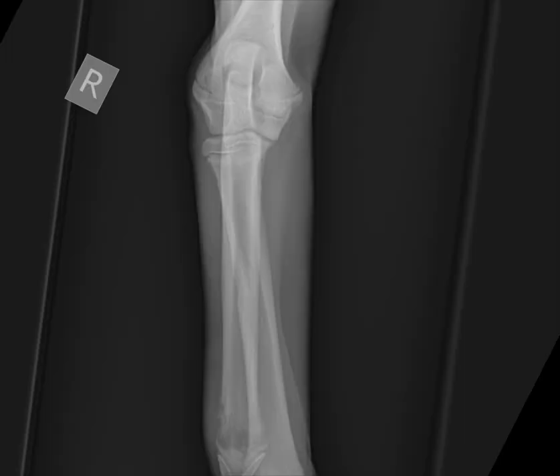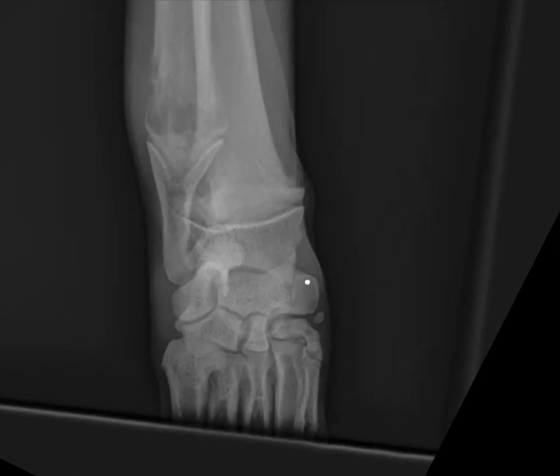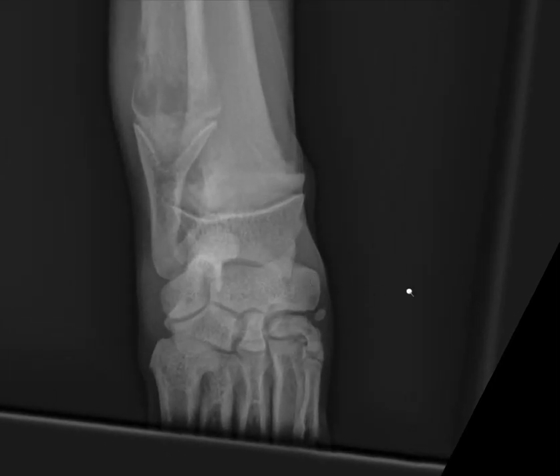I'm going to switch to this view to look at those findings in a little more detail. So here I've zoomed in on the distal antebrachium and carpus. While I'm assessing the physis, I can see again, we have a radiolucent band on the metaphyseal side of the physis, affecting both the radius and the ulna, although the radiolucency is somewhat more pronounced in the radius. The physis itself, you can see, is actually fairly well defined.